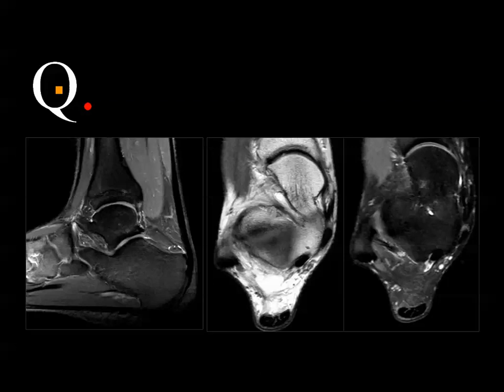This is MRI of the ankle, and this is sagittal, this is axial T1 and axial. Calcaneonavicular coalition, calcaneonavicular coalition, and الcalcaneus اهو وادي النافيكيولار. تيلو calcaneal coalition and التيلس ودي calcaneus.